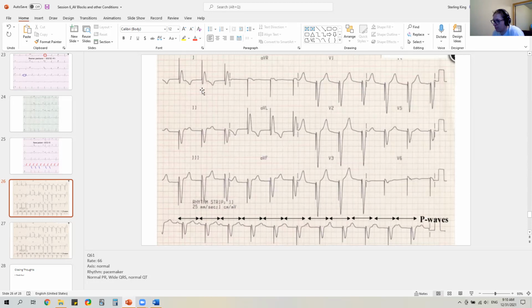And so if it's got a bundle branch pattern, generally just this kind of knowledge piece, pacemakers are usually paced with the right ventricle if they're pacing through it. So the rule of thumb is if it's in the right ventricle, it shows up like a left bundle branch block because the right ventricle goes first, and then it comes around to the left ventricle. So it's as if there's a delay on the left side, which is the left bundle branch block. And just based on, again, just kind of knowledge, left bundle branch blocks you don't interpret. So left bundle branch block equals done.